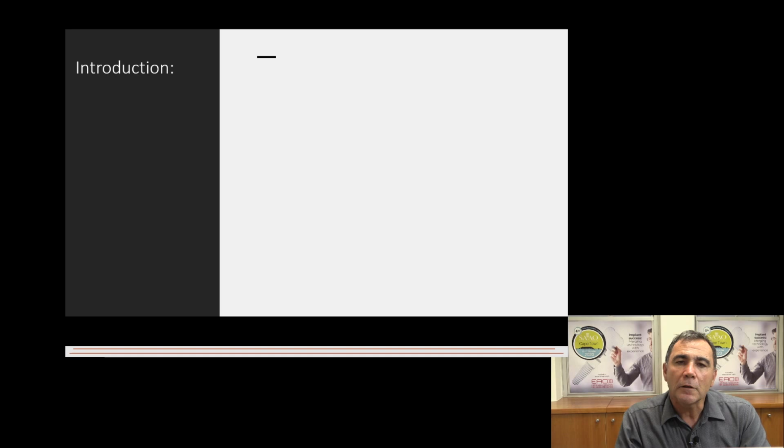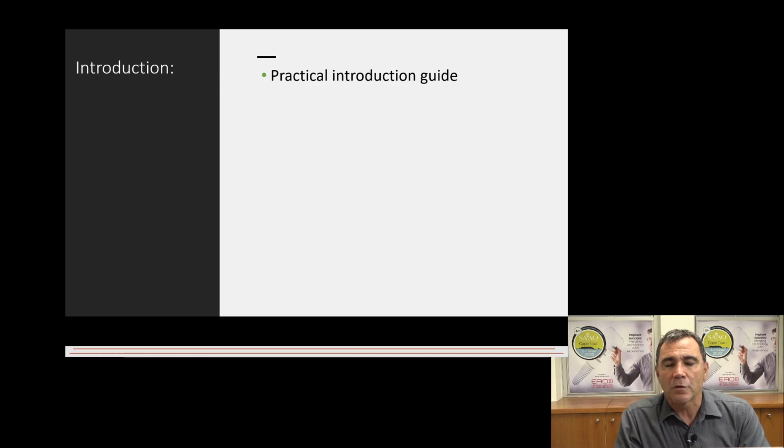Tonight I would like to introduce especially the younger dentist to CBCT. Once you have received your CD and you've opened that up and you've installed the program, that is where I start. I am not going to talk about reasons why the CBCT was taken, whether it was correct decision making to do the CBCT, or any of the technology of the CBCT.